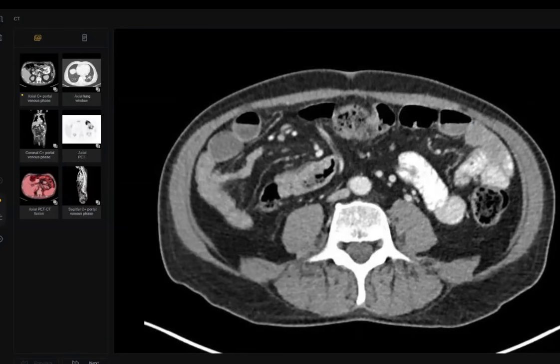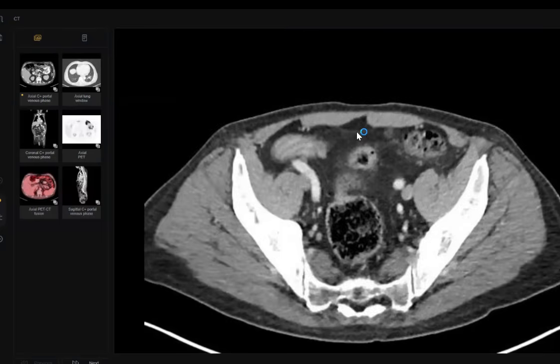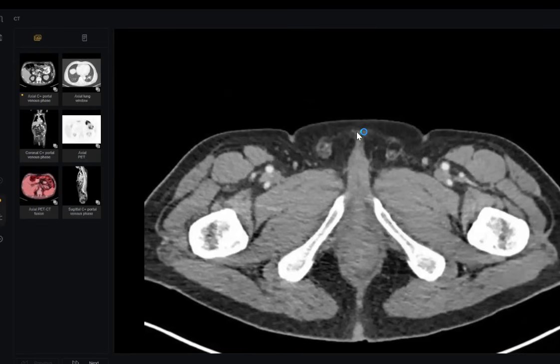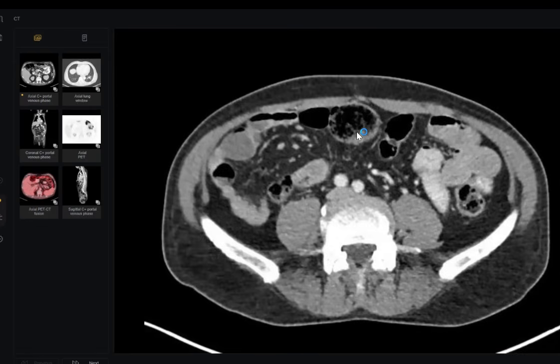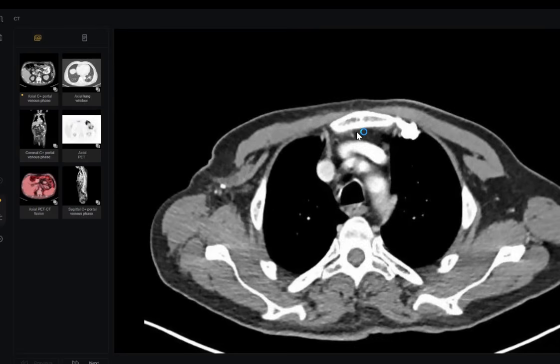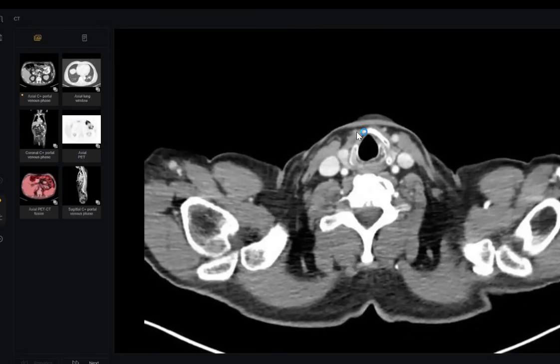Some very important learning points for all of us. Please look at the exam from the first slice to the last one. By the way, I lost one viva case because the answer was in the last cut, and I got one the opposite way from the last cut also.